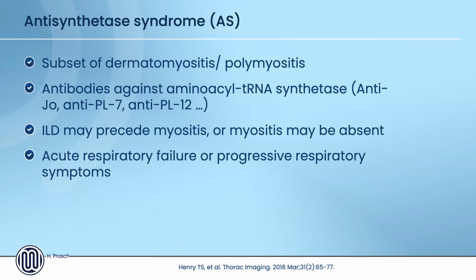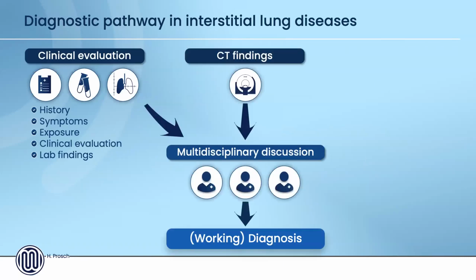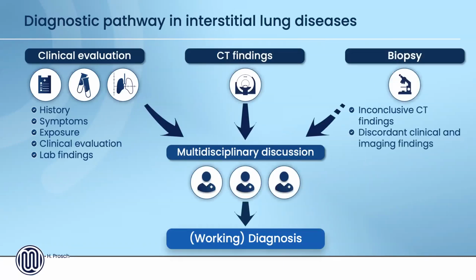The hypersensitivity is something you see as a response to methotrexate therapy. The diagnosis is not too difficult from a radiological point of view, but you may also see hypersensitivity pneumonia, either the chronic form or the inflammatory form, in patients with connective tissue diseases. So this is always a differential diagnosis, and this is so important why we should sit together in these multidisciplinary team discussions to come up with a diagnosis.